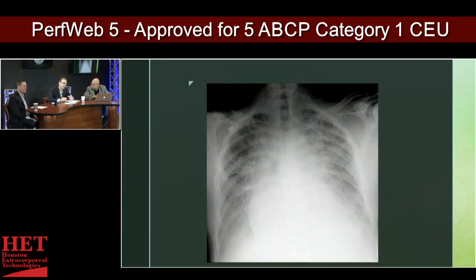So you don't have to look at this and pontificate and rub your forehead or your chin and say, this patient is fluid overloaded, they have pulmonary edema. I would have ordered. It doesn't have to be that complicated. But yeah, what you described is exactly correct. You don't see the heart borders very well. Why is that? Because there's stuff blocking it.